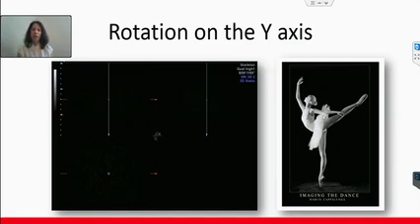So if we see the coronal in front, then the side is the sagittal. Now the C plane is like if we look at her from below or from above. And what we see is only the axial plane, rotating clockwise or anti-clockwise. So the y-axis is like the ballerina.